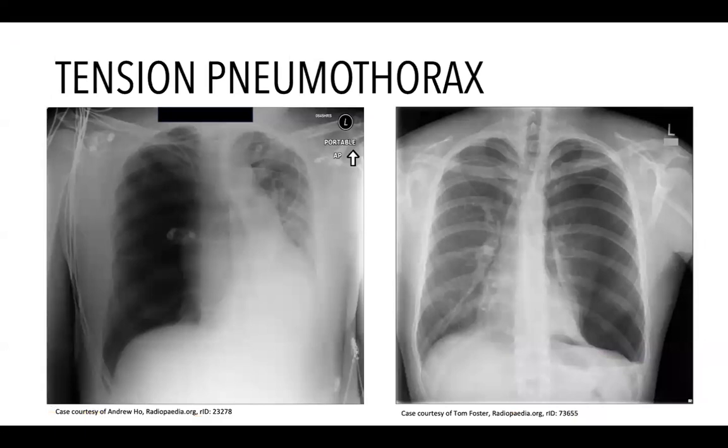spontaneous right lung collapse and subsequent tension pneumothorax. Let's apply some of the skills we've practiced in previous modules and examine the features of a tension pneumothorax. Note the left-sided central venous catheter with proper positioning. The right lung border is near midline, leading to a complete collapse. An endotracheal tube is in place and the trachea is deviated to the left. There is a complete leftward shift of the heart, and a deep sulcus sign is present on the right.